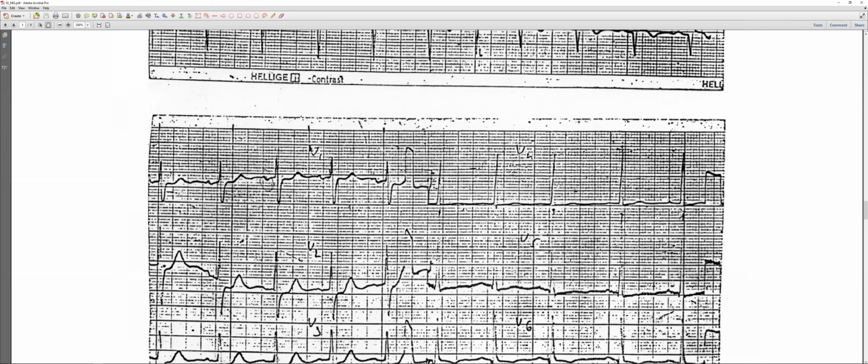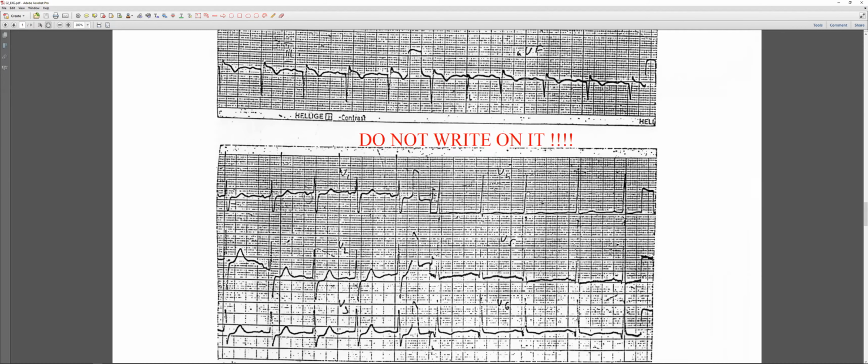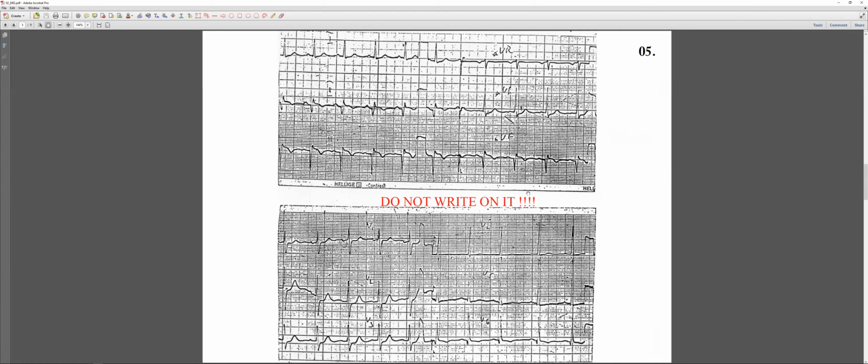Okay, this is the top of the V5. See? Okay. So it's about almost 28 millimeters plus 10. It's 38 at least. So that's hypertrophy of the left ventricle. Yeah. Okay, well, almost 4, but no. Okay, I'm a very tough guy.